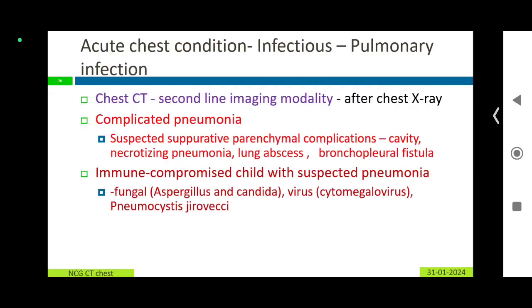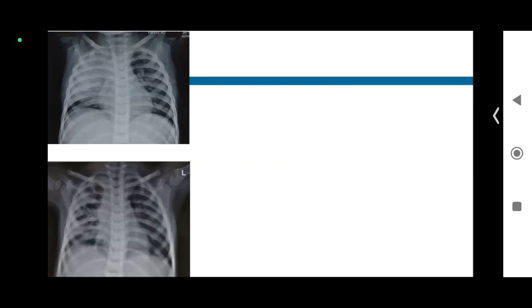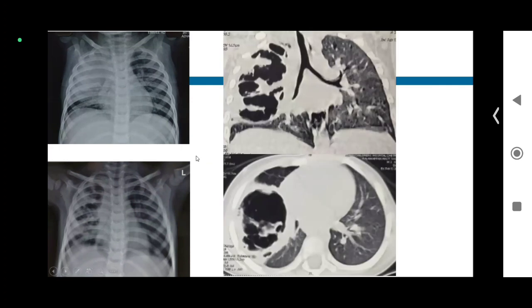That's all. Okay. Now, this is a child's X-ray. What one of the participants told, necrotizing pneumonia, multiple pneumatoceles. This is how the CT looks like. If you are going to ask for interpretation of this X-ray and CT, you look at the consolidation with treatment. This has become multiple cavities. In X-ray, there is no mediastinal shift.